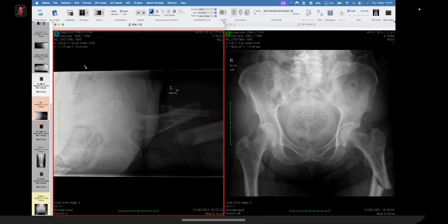Sir, there is a generalized mild decrease in bone density, because I can see the trabeculae prominently. I'm thinking of it in terms of a fracture because of the decrease in bone density. I think the bone density is pretty decent for a 77-year-old female. Okay.